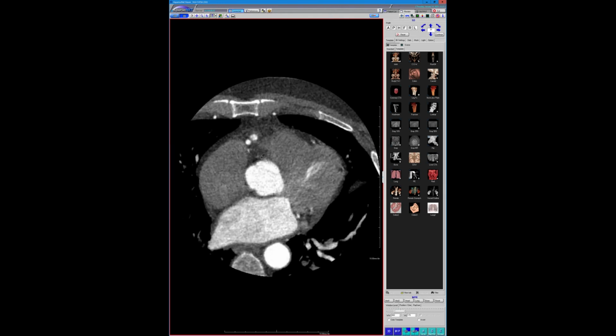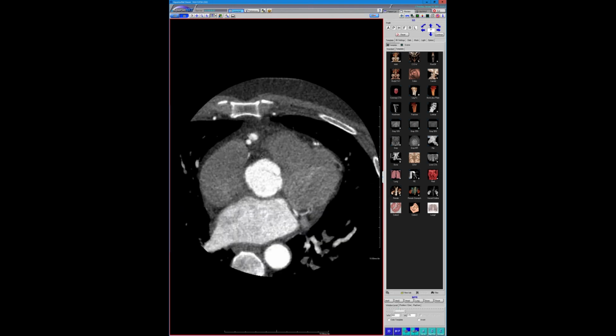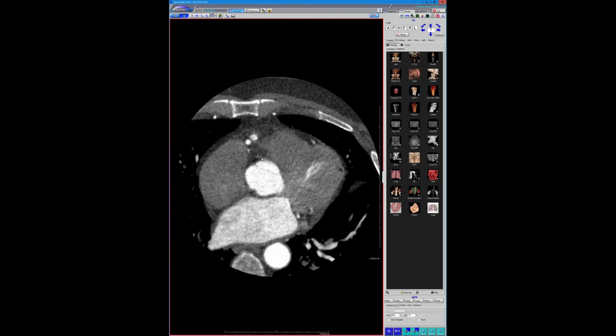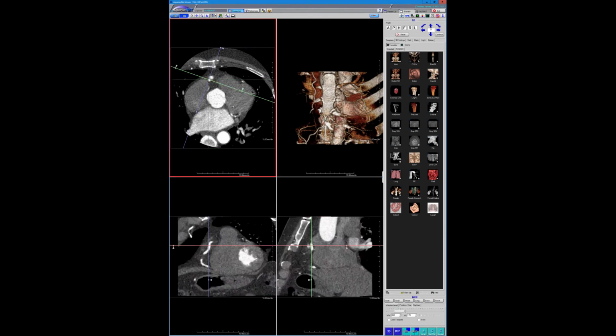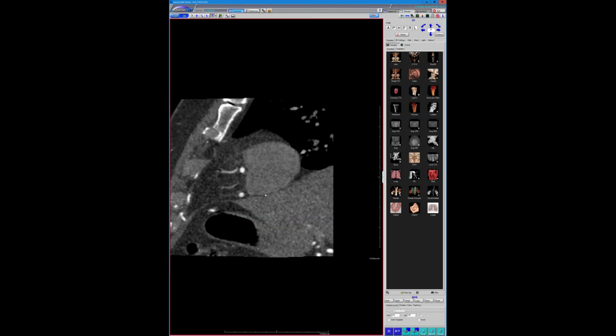There was no evidence of a pseudoaneurysm or anything coming off the vessels. We weren't sure, maybe it was hiding back there, but they did their multiple rotations. The other injections were pretty crappy, but there was nothing clearly definitively coming off. So we were kind of stumped. We don't know what the answer is, or what to think of it.